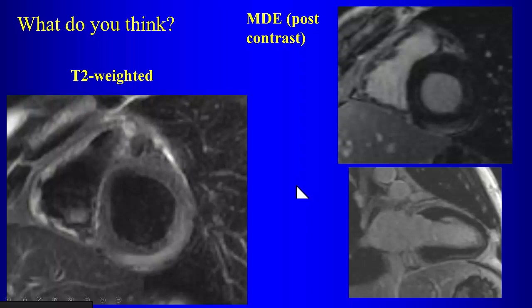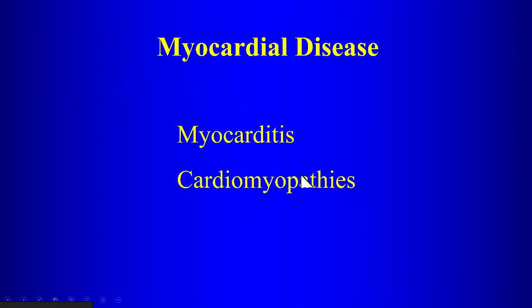Jose says no. Why not? Yeah, the endocardium is spared. With myocardial infarction, it should involve the endocardium. Here the endocardium is spared, so this is involving the epicardium. So with the history of chest pain, elevated cardiac enzymes, edema, and this enhancement pattern, what do you think this is, Jose? Myocarditis, right. Acute myocarditis would be your diagnosis here, okay?